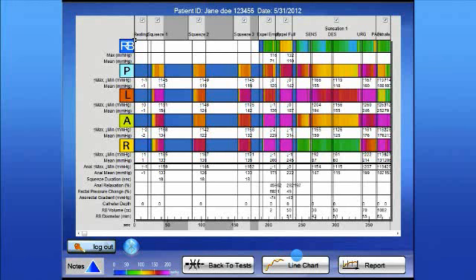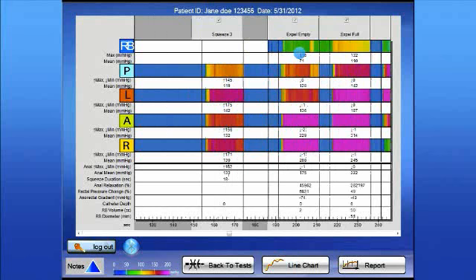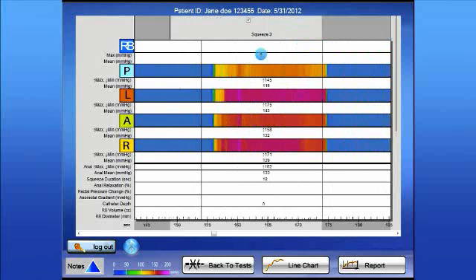If you choose to zoom a particular area of the test, all you have to do is use the pointer pen, touch the screen, and drag it up to a location, and it will zoom to that particular screen to give you more detail. And you can continue to do that to get very high-resolution detail if you choose to. This screen depicts 15 seconds of the actual squeeze test.